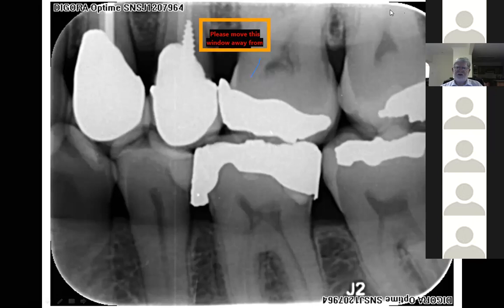Okay, okay, okay. So we're getting monitor, OHI, monitor, reassess, retain, leave as is, and monitor. That's fine. The ultrasonic won't remove that. No, maybe the ultrasonic would remove that. You'd probably be able to remove that with curettes as well and smoothen over with the ultrasonic. You won't be able to touch this.